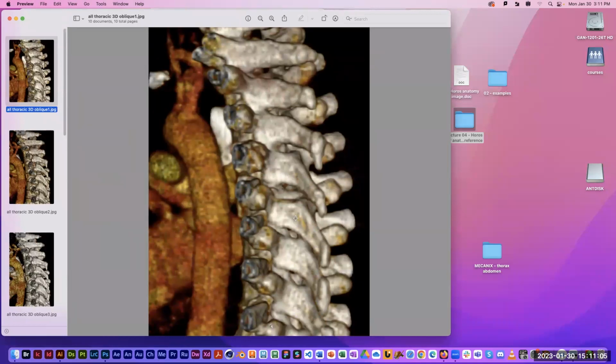And there was not very good data. The imaging data was not very good. So it really took a lot of tweaking with things like the 16-bit color lookup table editor and some of the other features in Horos to try to be able to see the different fractures, especially. I mean, you can kind of see in here. I don't know if you can see what I'm pointing at with the cursor, but there's a transverse fracture right there through the lamina, through the base of the spinous process of T5.